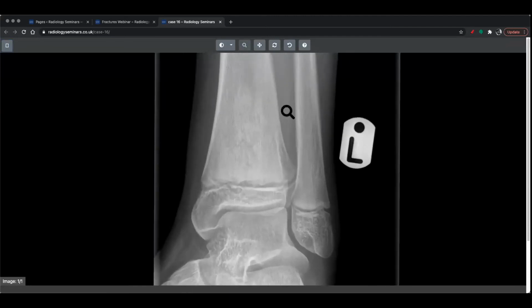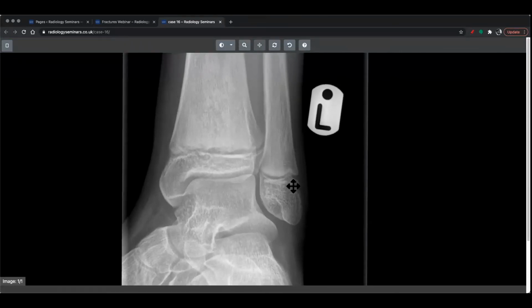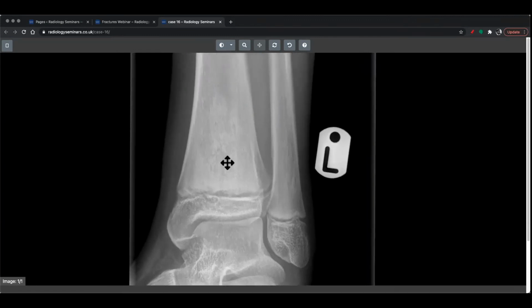Again, a pediatric x-ray. I just want to illustrate to you guys, these are normal cortices. This is normal growth plates because they're kind of getting a bit more sclerotic as you come towards the edge. Yeah, you can see that, right? However, exactly right. Some people are really good on this. You're giving me a run for my money today.